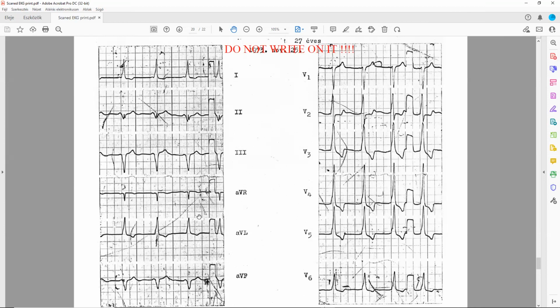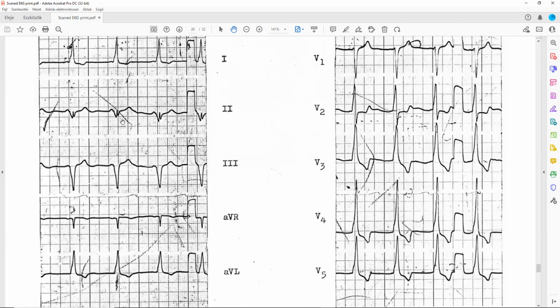Okay, now let's go on. So we do have rhythmicity. Okay, next one. I don't think there's a P wave in each one. For example, AVL doesn't look like it has any. Let's see a little bit. Look, this is a P, this is a P in lead number 2, and in AVR we do have P waves. So we have P waves.